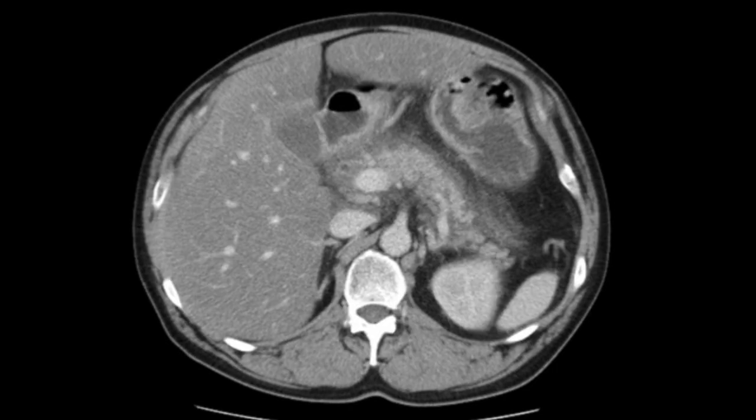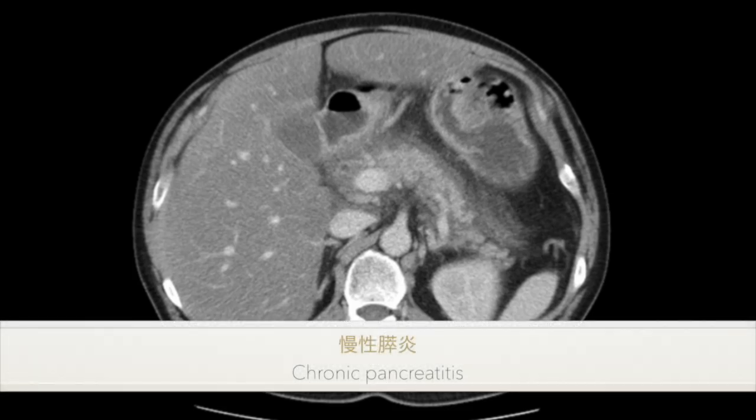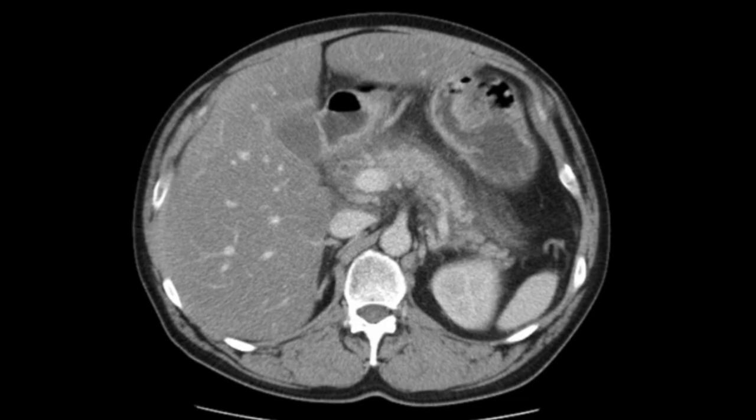Radiologically, our job is to detect pancreatitis and exclude causes like common bile duct stones or pancreatic tumors. Regarding alcohol-induced pancreatitis, you cannot see alcohol itself on imaging, but patients typically have chronic overconsumption, often leading to repeated bouts of pancreatitis, so-called chronic pancreatitis. Repeated inflammation can cause the pancreas to shrink, lose its granular structure, or become fatty and vacuous. Such changes make alcoholic pancreatitis easier to suspect.